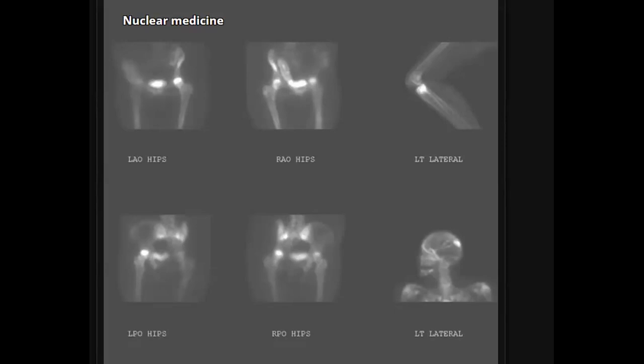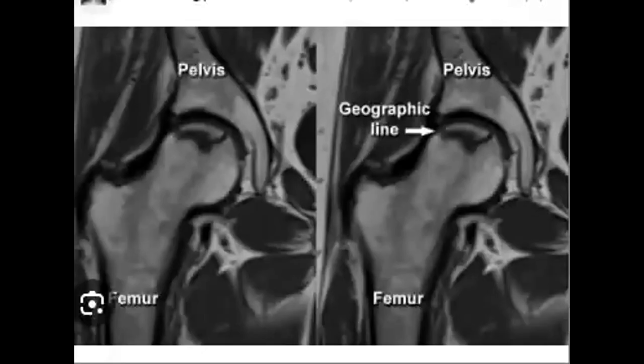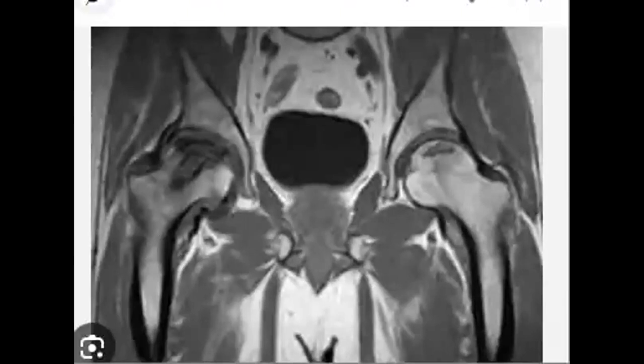If you check the MRI in this patient, what do you think? Yes, you will find that this patient has avascular necrosis, AVN, like this. You will find bilateral avascular necrosis, which is a common finding and can happen in patients who have a transplanted kidney. Yes, a bit difficult case, but yeah.